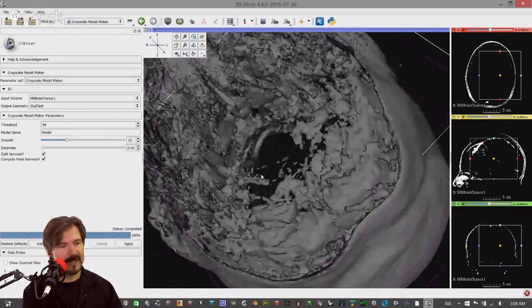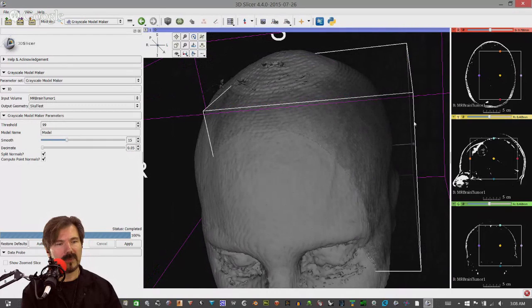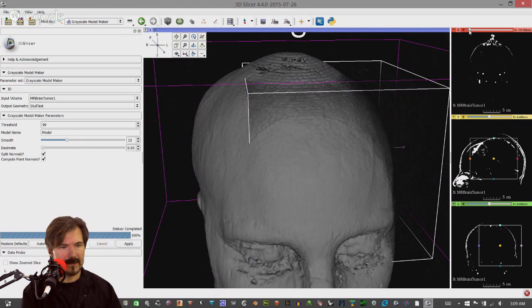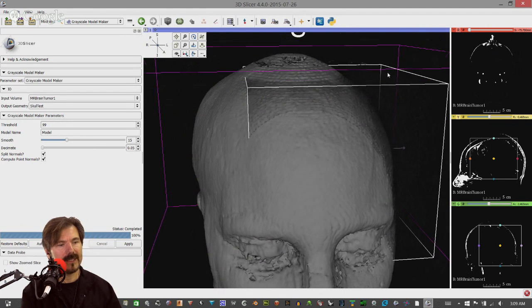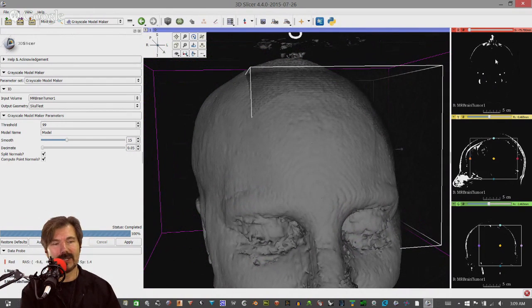But if you look further in here, and we're going to do another little trick shortly, it's empty. Because what it's doing is modeling all this information off to the right-hand side. And see how there's little speckles in there? All those little white speckles are being produced as voxels. So if you go to the bottom, see all this little white area here? That's what this is. So you really have to work hard at ensuring you have a clean model.